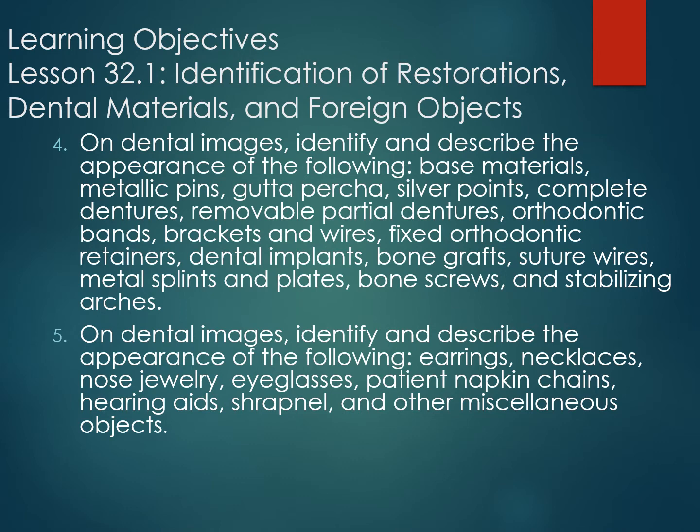And on dental images, identify and describe the appearance of the following: earrings, necklaces, nose jewelry, eyeglasses, patient napkin chains, hearing aids, shrapnel, and other miscellaneous objects.